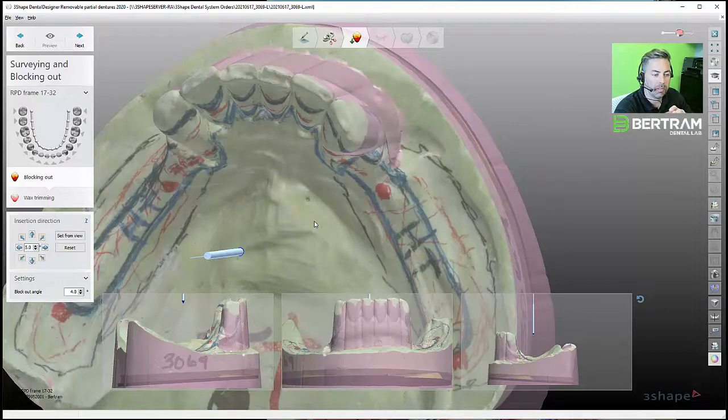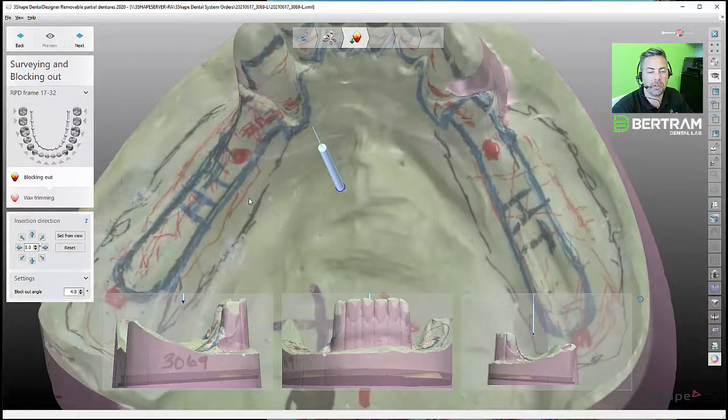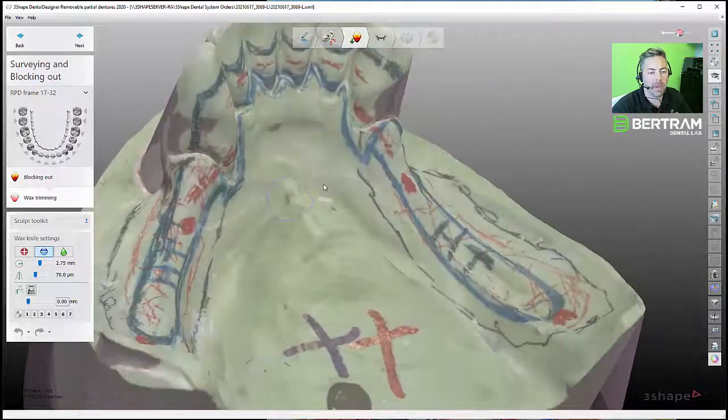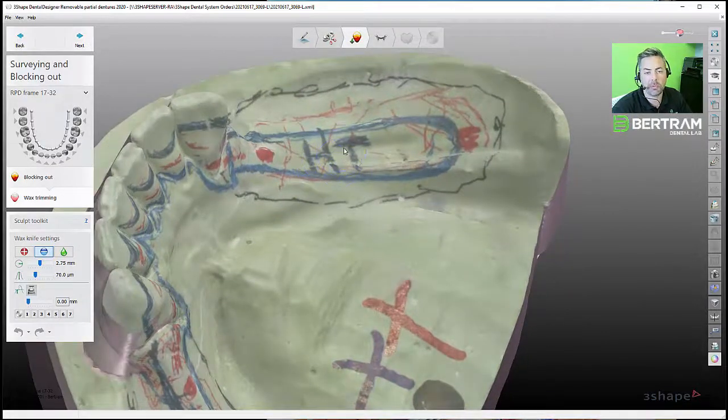So in the software, there's a maximum resin gap, which is 0.9. So there's no way to achieve the total that we're looking for. There's only one workaround in that case, and that is to manually add blockout. So what I need to do is add 0.4, which will be my thin, and then when I actually add the mesh, I'll set that at 0.8, so that'll get us our heavy and thin.